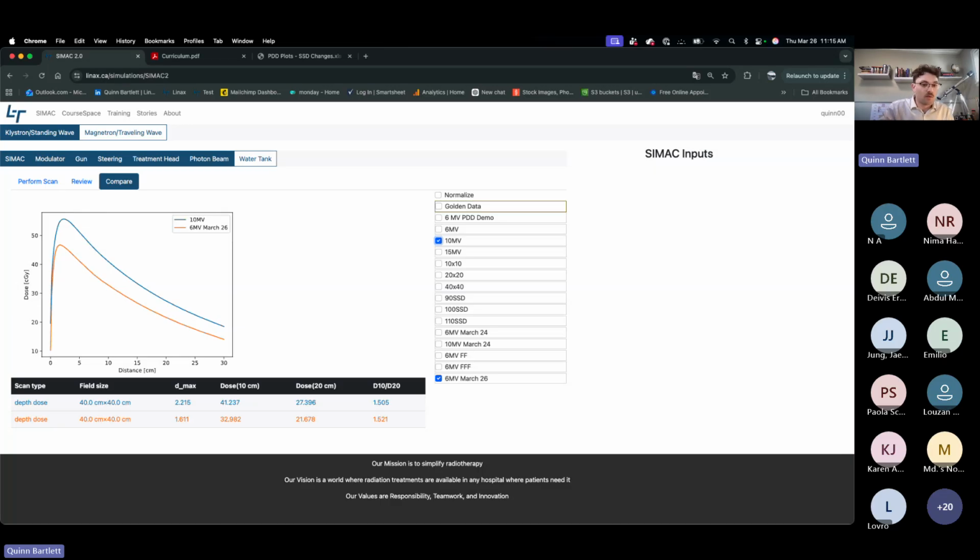Really what we're seeing when we upload a 10 MV beam is that we're contributing more high energy photons. So the photon beam energy is increasing, or the average photons that make up your dose have a higher average beam energy. As that photon energy increases, our PDD becomes higher at greater depths because the beam is more penetrating, obviously, right? As we're seeing that higher dose.